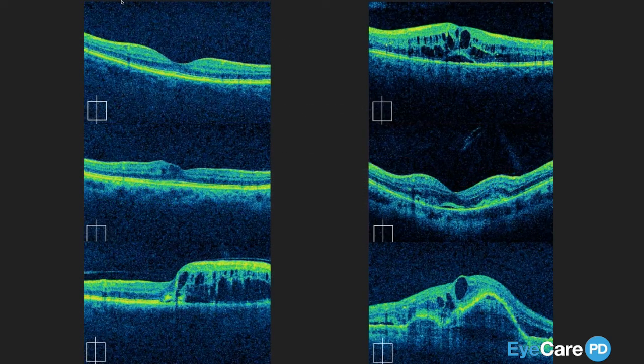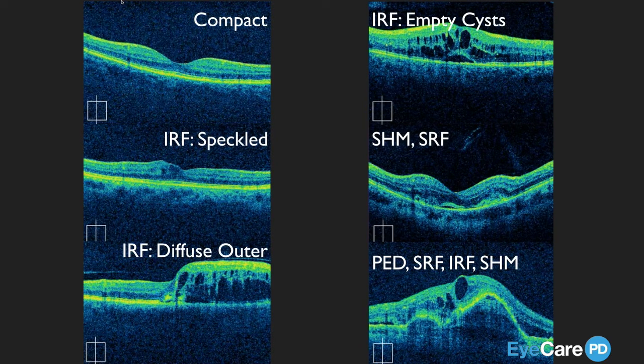What do I mean? Well, let's look at these 6 examples. In these 6 examples, you see that they all look very different. You might not, at a very quick first glance, have the words to be able to describe each of these 6 images, but yet all of these images look very, very different. Let me help you out here by giving you the words to begin to describe these images. Here are the words that we often use.